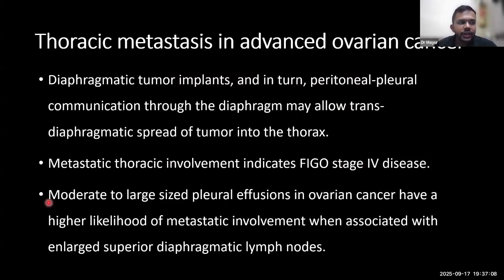Whenever we see moderate to large amounts of pleural effusion in ovarian tumors, along with supradiaphragmatic lymphadenopathy, there is a very high likelihood of metastatic involvement and it should be looked for carefully.